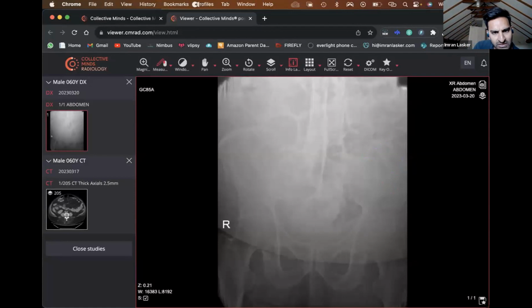Someone says opacification, haziness of the pelvic inlet. So yes, you can get a bit duped by something like that. I mean, that could be the urinary bladder. So unless it's completely obvious, I wouldn't be too worried. So let's just say, look, we can't see anything going on.